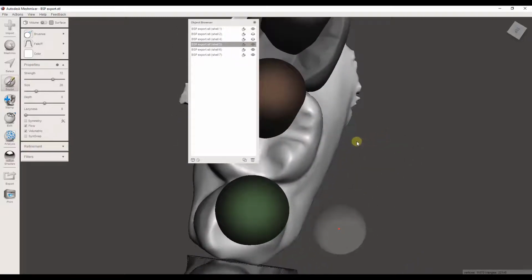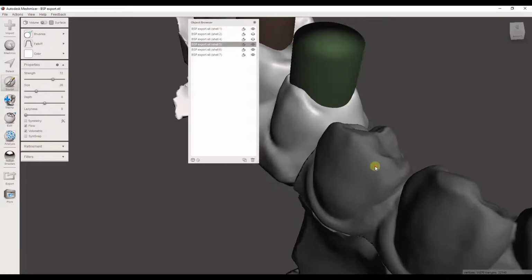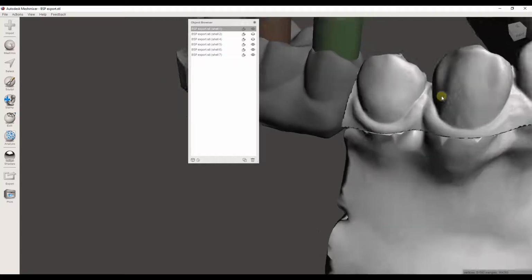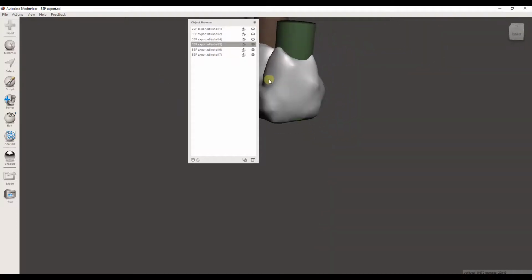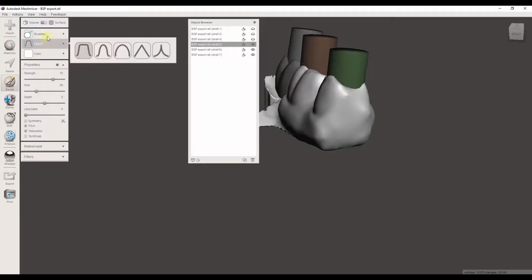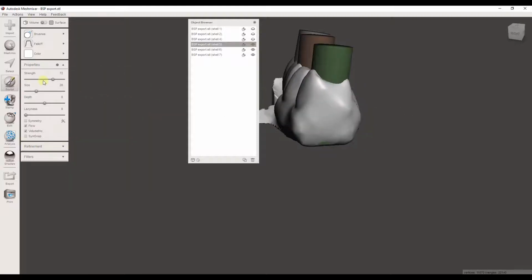And you can also use the eyeball function on this white model, and I'm going to turn it off and then go back to this so that that other part's not in the way. And again, sculpt, brushes, shrink smooth, and I may turn down the strength a little to make it a little more subtle right here.